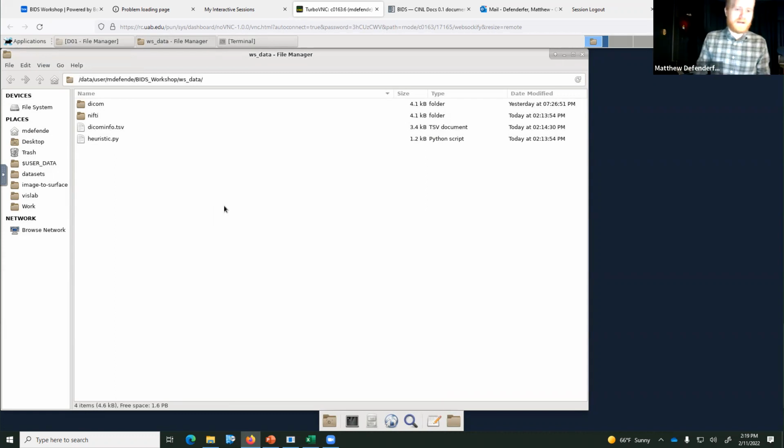Awesome. All right. Yeah. It creates it as a hidden folder because technically what happens is that every time you run the HeuDiConv command, it recreates that hidden folder and creates a new directory for each subject that's run through it inside it.